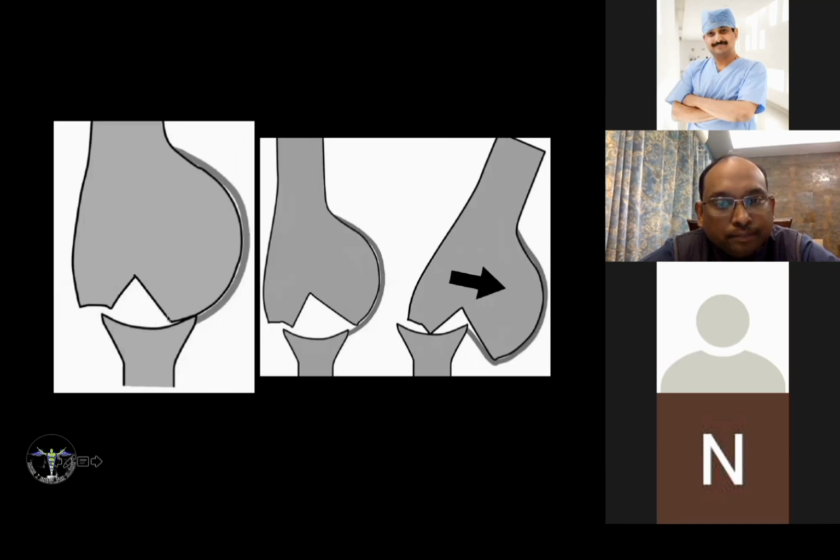So what happens in this case? There won't be any tracking off, the humeral head will not go out of the glenoid. Whereas in this case, the Hill-Sachs defect is larger than the surface of the glenoid. This is the mid-range movement. When there is an extreme range of movement, this will toggle off anteriorly because the gap in the humeral head is larger than the glenoid. In that case, it will go out of the glenoid, and this is what is called the engaging type of lesion.